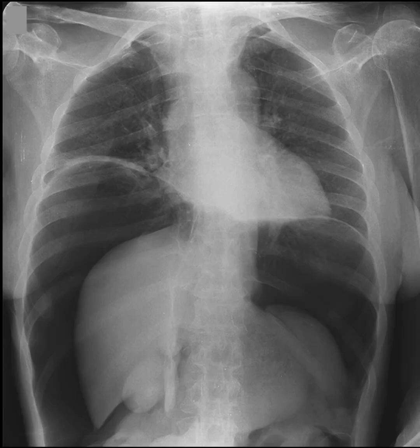All right, so this is one of the most impressive x-rays that you'll ever see. This was sent to me by an emergency practitioner from another country without any clinical information whatsoever. So let's go through and break it down, and then we can deduce what we can about what was happening with the patient clinically. All right, now, at first blush, this x-ray should strike you immediately as being very abnormal.